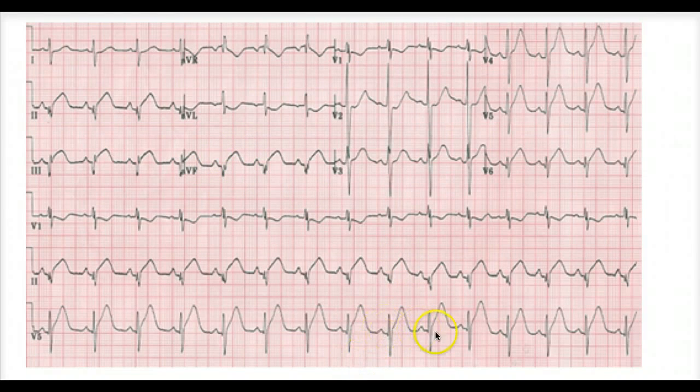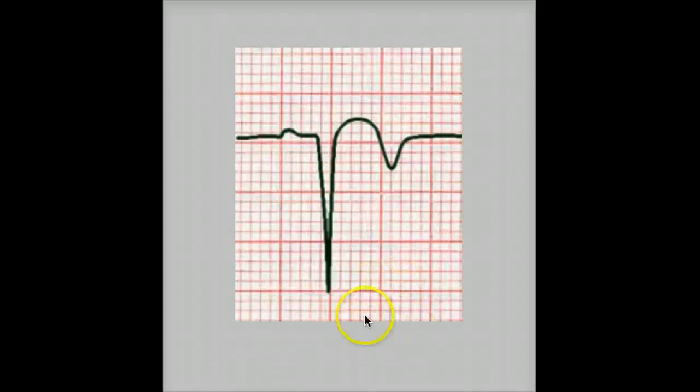We see a Q wave followed by an ST segment elevation. Now we're not considering these because we can see PQRS normally. So these ones don't qualify. We only look at the ones where we have a Q wave followed by an ST segment elevation. So in this EKG, this is again a huge picture of a Q wave and an ST segment elevation. There is no substitute for examples, right? So we could never get sick of it.